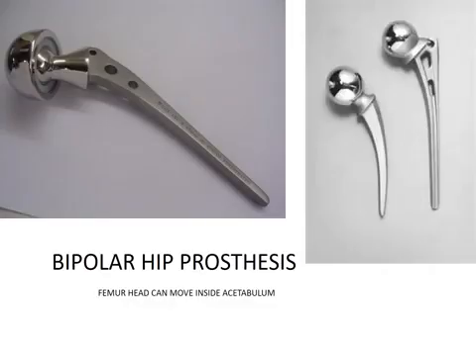When we have bipolar prosthesis, Austin Moore and Thompson are unipolar because they don't allow movement inside. Talwarkar made a prosthesis which was bipolar. But then we have modular bipolar. In modular bipolar, you can have movement of the head inside the cup and the cup in the acetabulum. So they allow movement at two places. The head inside the cup of the hemiarthroplasty and the cup in the acetabulum.